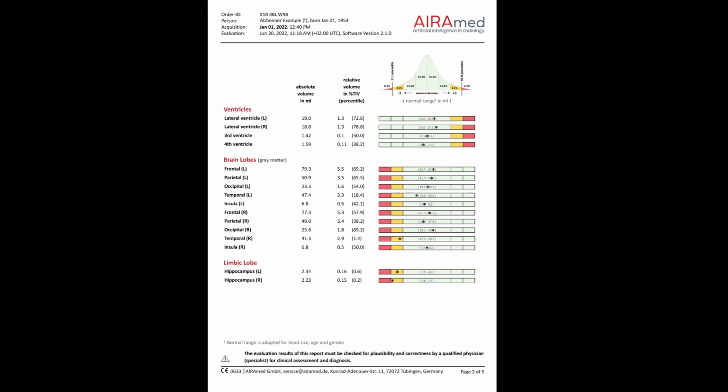On page 2, we note that the identified widening of the ventricles is still according to age. We are only detecting a minimal upward deviation in comparison to the third and fourth ventricle, which is, however, still within the usual variability of these anatomical regions.